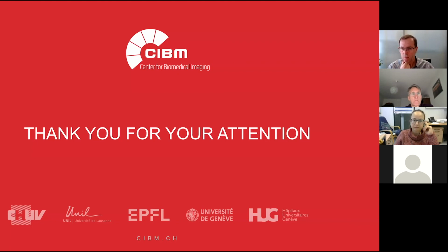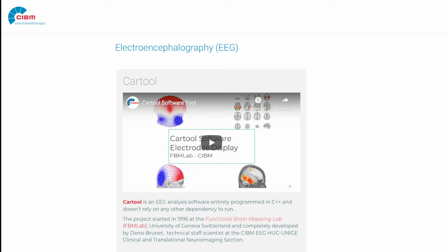So is there a chance to introduce, for example, the gray matter segmentation as a mask to select the solution points? Or is there a way in Cartool as well, for adults, for healthy brains, to introduce the surface, for example, to just restrict the solution to the cortical surface?